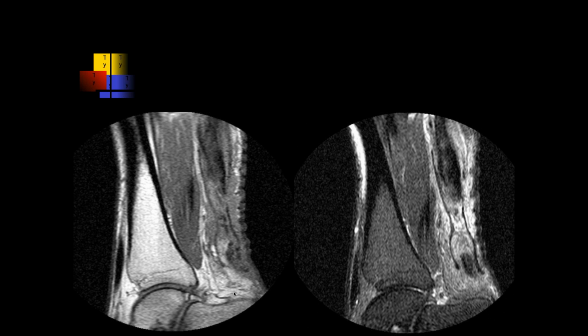I'd like to see the preoperative images to be sure that this is another tear, but it looks like a tear of the Achilles repair. There's retraction. I think that's surgical material. I'm not sure what type of material, but it doesn't look like it's natural.